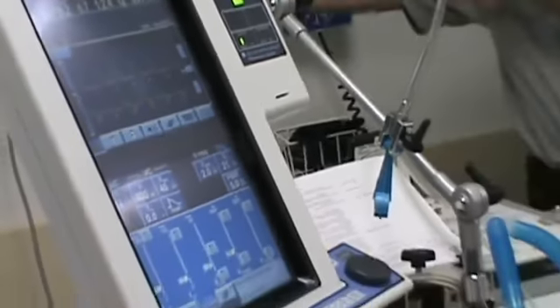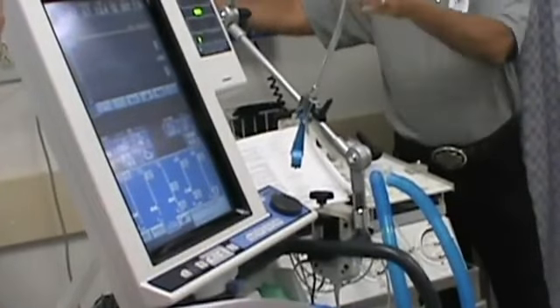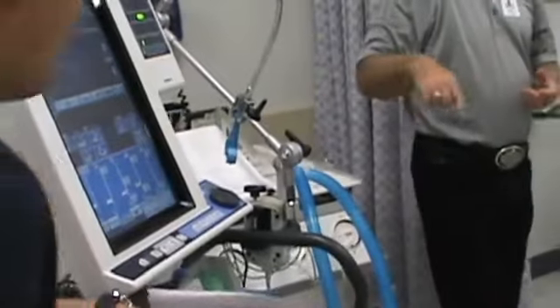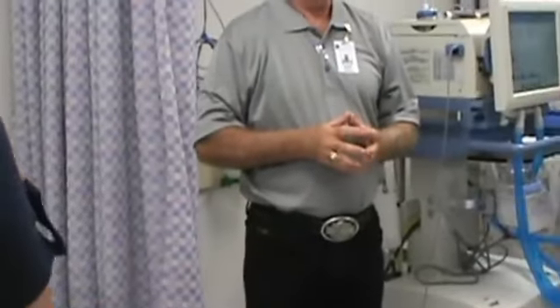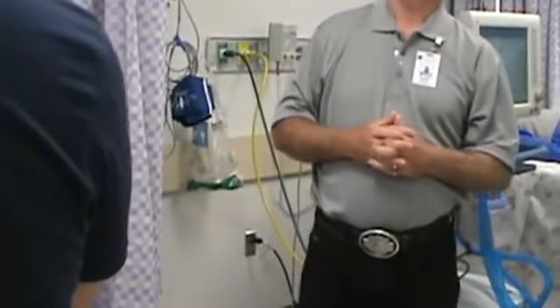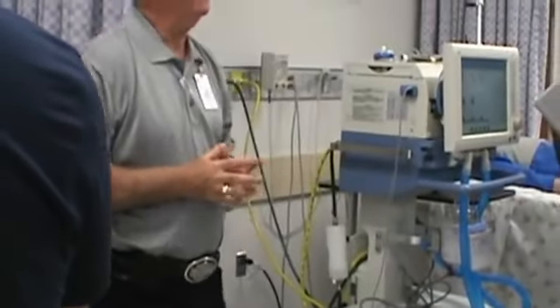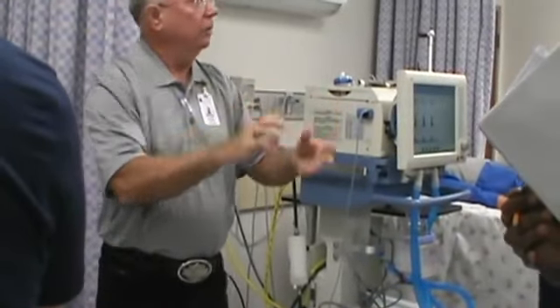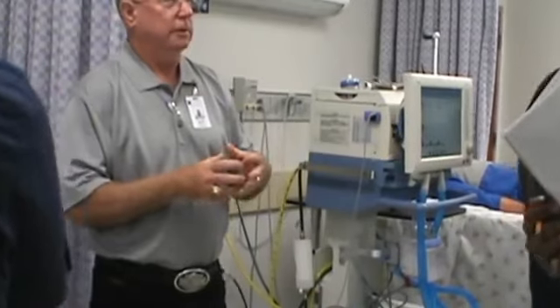So how do you know how to compensate for, let's say you're running 8 liters on the nebulizer back here? How do you compensate through the vent for that extra 8 liters flow coming through the vent? All right. What do you adjust it to? How do you know the adjustment? We're going to lower the tidal volume. That's what Joel told me. How far down are we going to go? What's our guideline? Cut it in half, third, fourth?